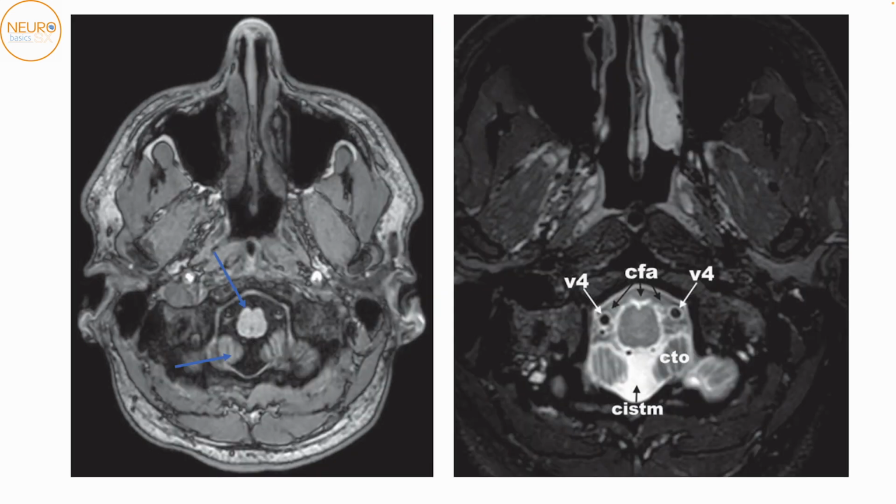As you come further down, we're able to see that we're entering slowly the region of the foramen magnum. So this is almost at the region of the foramen magnum, we're able to make out this is the medulla. It's trying to turn into the spinal cord now. And only the cerebellar tonsils are left behind the medulla. There's also a T1 and T2 hypointense structure running next to the medulla. So those are your vertebral arteries over here.